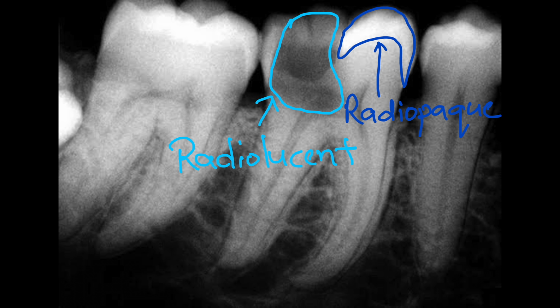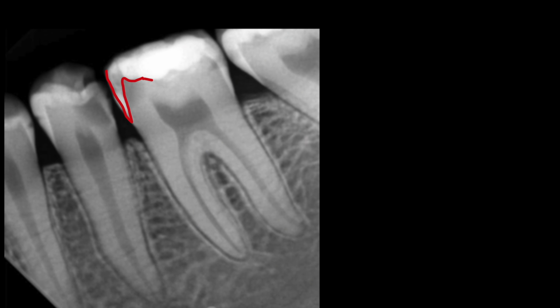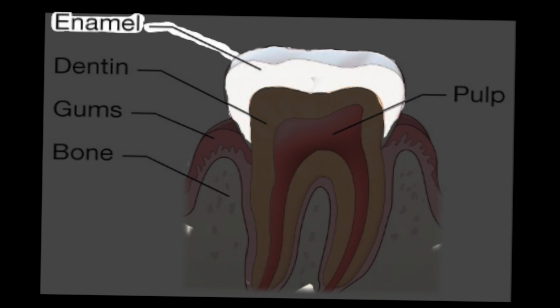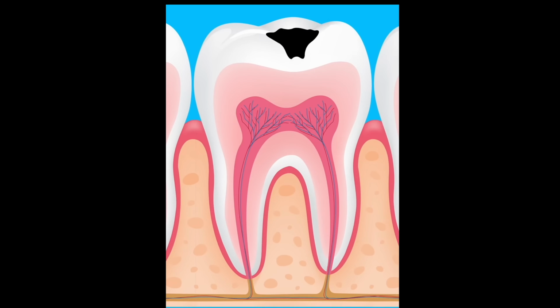Let's break down the radiographic lineup of your teeth. No need for a magnifying glass, just a good oral X-ray. First, we have enamel, the overachiever of the bunch. At about 95% mineral, enamel is the most radiopaque substance in your body. On an X-ray, it's like the VIP section: bright, shiny, and impossible to miss. It's doing its best to protect your tooth, so give it some credit.